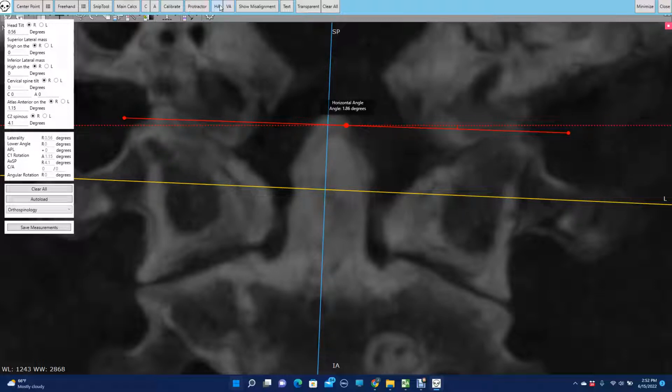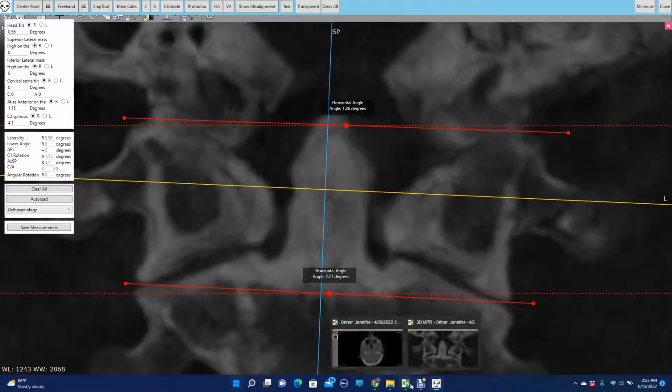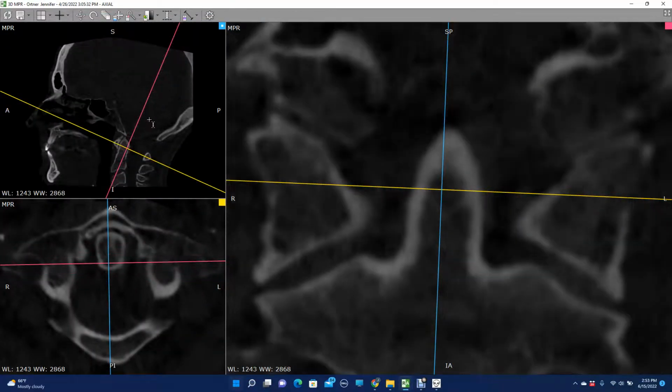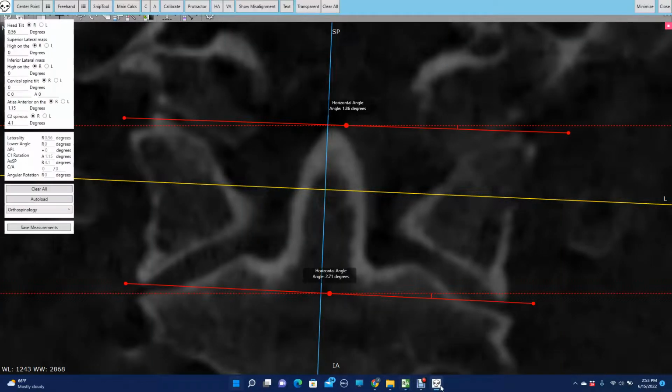And we can do another one for the bottom. I'm going to put this over here, put this right over there, start moving it up. Looks like it's a little too tilted, so we can use the arrow keys to increase the tilt until we get a nice icing on the cake effect. Some people are going to prefer to do this in a single slice. Sometimes I often do it this way. And we can see, did we get good agreement on this line?